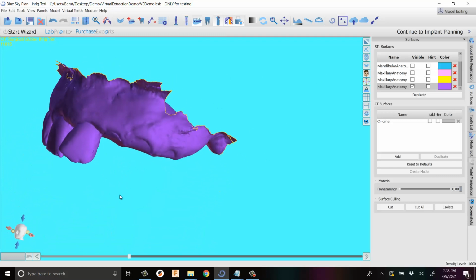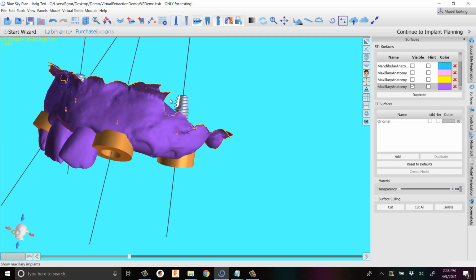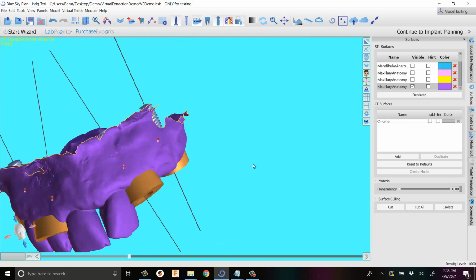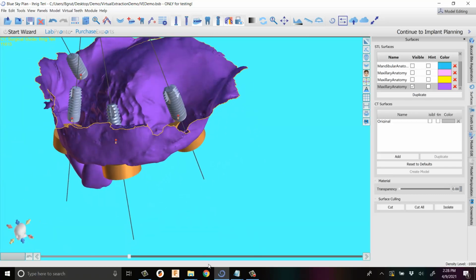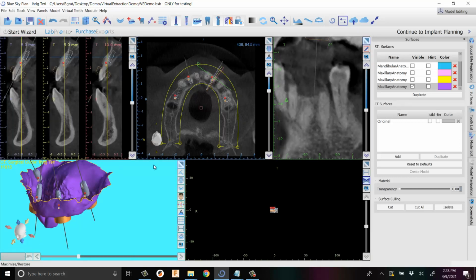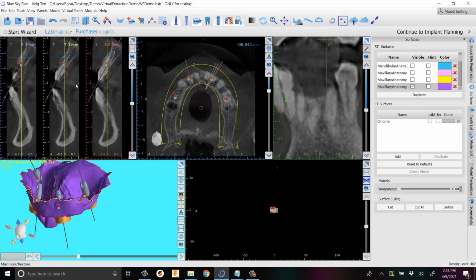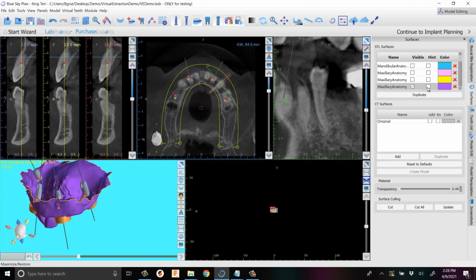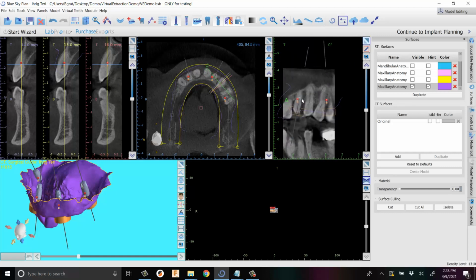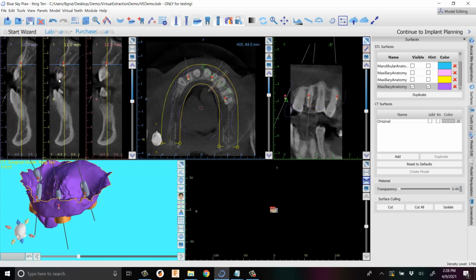And lastly, if you want to have indents there, because you're going to be placing implants here and there, and you're going to be making, we'll say, a fixed bridge, and you want to have pontic sites developed in your model, well, that's not too hard to do. I'm not going to go through all of it, but again, it's the same thing that we did earlier. And all we're going to do, instead of, I don't even need to bother going into the implant panel, I'm just going to, let me see. I can edit the outlines. Yeah, I guess it is actually, yeah, here we go.